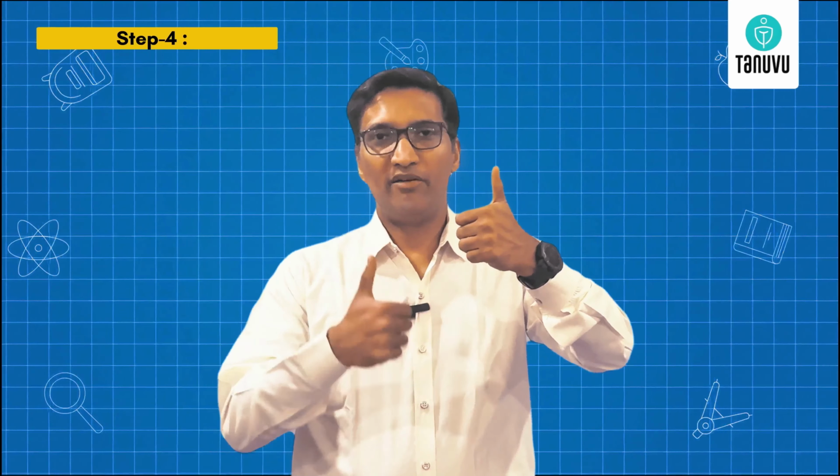The simple way of reading the axis of the heart is by simply looking at 2 leads, lead 1 and AVF.